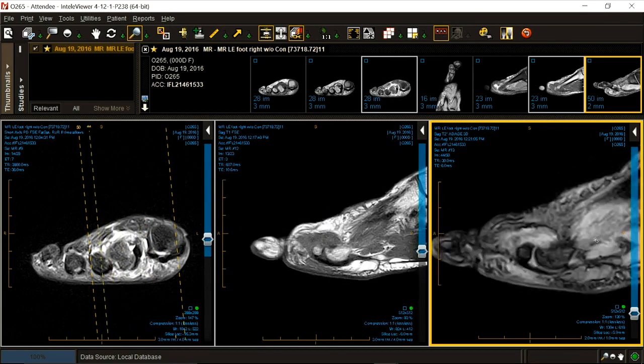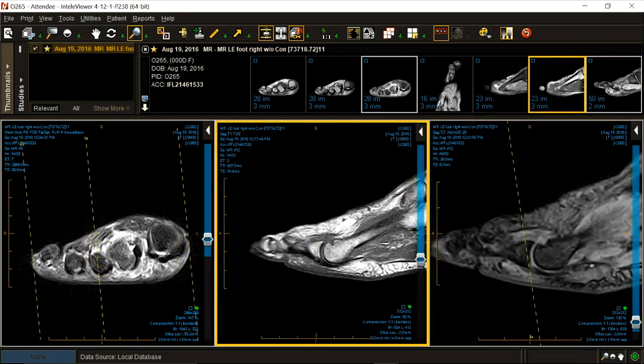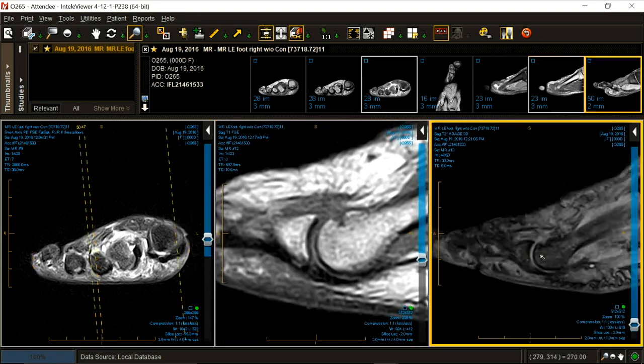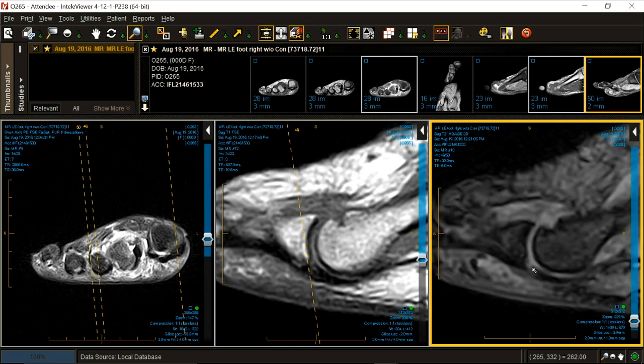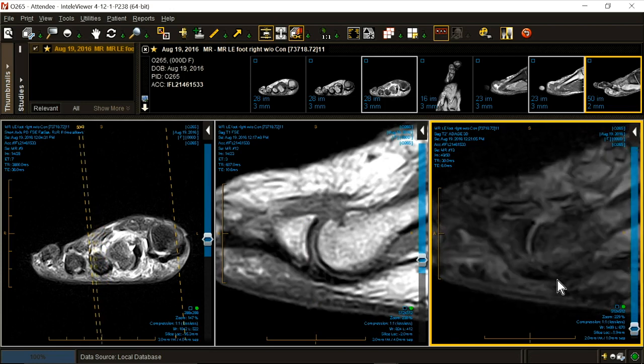Let's go to the third digit. Let's make it a little bigger. So I don't mind that the plate is a little attenuated as it approaches the toe. It's not going to be flush against there because remember there's a little cartilage here. But the course is straight. It makes a clean arc all the way from one side to the other. Now in this case, in the second toe, we tape the toe back a little bit. Let's see what happened to the second toe.